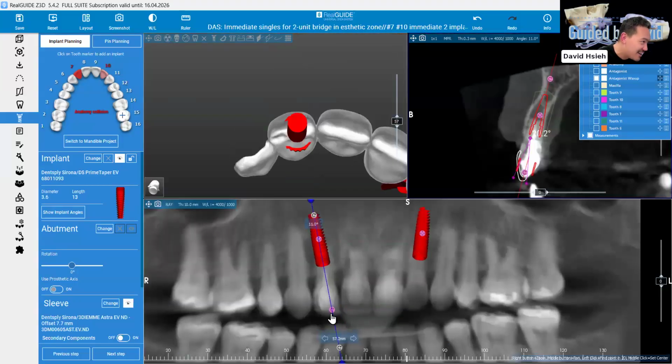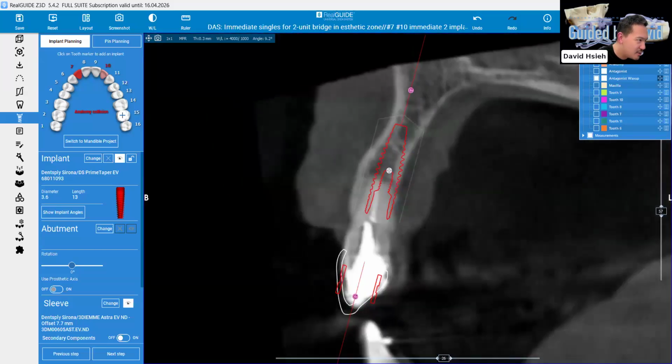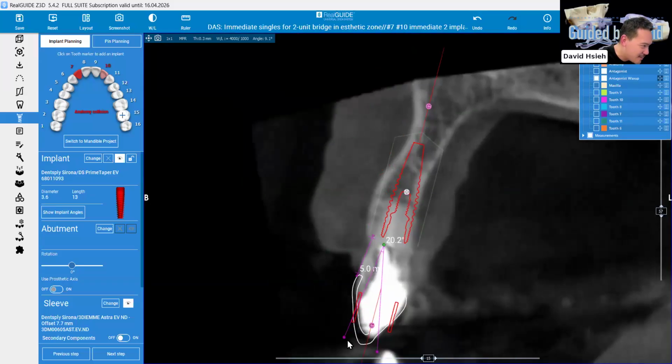That's great, right? So we can push our boundary there, kind of pushing to the limit, but oh, this is a little pushy here. Okay, so we still have to see 360. All right, so we can now match it again.